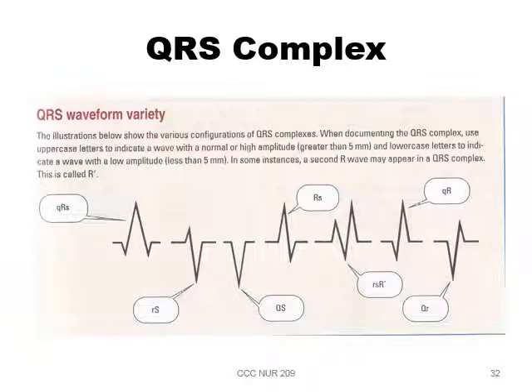These are the different QRS complexes that you can see. Take a look at this. I'm not going to quiz you on this, but just kind of understand it. If you looked at it generically, you're going to call all those QRS complexes, but it really depends on what book you read. I just want you to know they're QRS complexes. That's what I want you to know at this point in time.